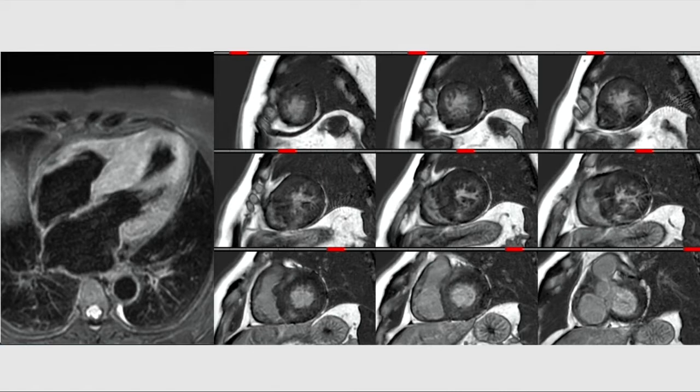This is a short axis LGE sequence, which is a PSIR sequence, showing areas of enhancement in the insertion points of the interventricular septum. These are the anterior and inferior insertion points of the septum, and we are seeing patchy mid myocardial enhancement in those areas. This is again one more characteristic feature in HCM patients: patchy mid-myocardial enhancement in the hypertrophied areas as well as in the interventricular septal insertion points. So this is a case of classical HCM.